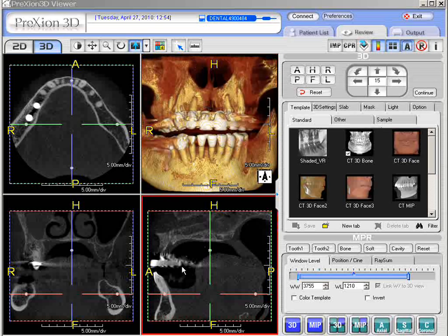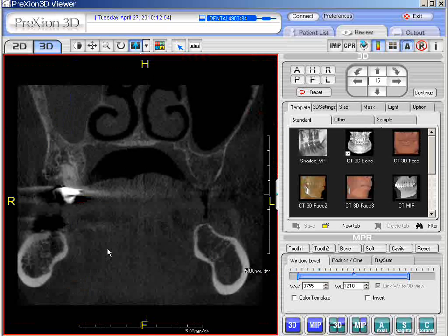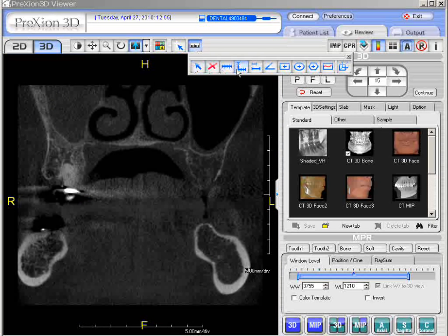Now, if we want to measure a function, first of all, after we survey and pick a section out in any of the frames, we can launch a particular screen, or you can stay in the 3-in-1 format, whatever one wishes. Go up to the upper toolbar, and you'll notice the last one is the measurement icon. It looks sort of like a piano, if you will, a little ruler. So if you click it, it's going to open up these tools in the toolbar underneath the measurement tool.